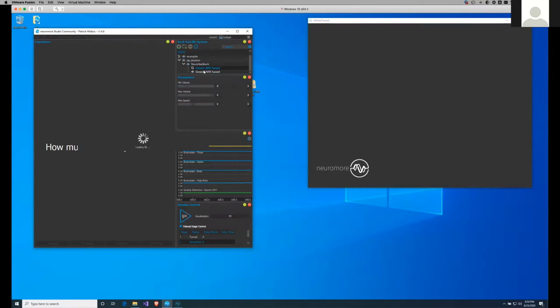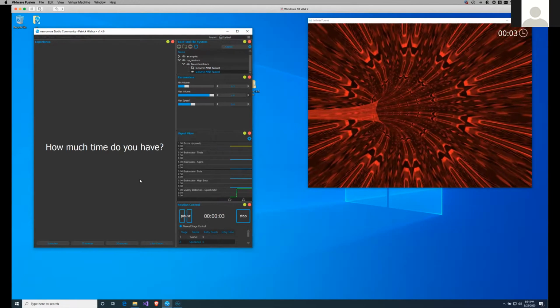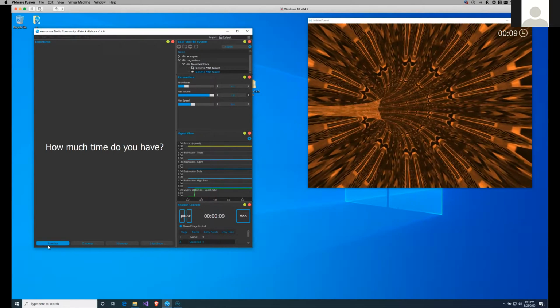Yeah, absolutely. So let's make sure it's loaded. All right, now we start the session. We press the play button, and the tunnel is being initialized. And now, how much time do you have? Let's just say we have 5 minutes. You see the buttons down here.